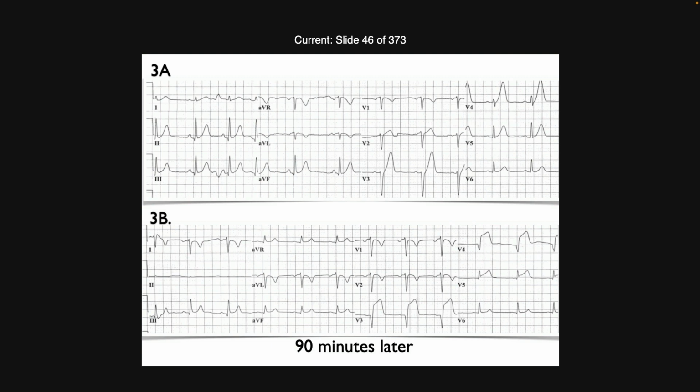So, on the top strip, would that be an NSTEMI? Which one? The top one? Non-ST elevation? No, because there's no ST depression, which is what we look for a lot. It makes more sense to think of it as a developing STEMI with the hyperacute Ts. So hyperacute Ts, if that's what they are, will develop into ST elevation.